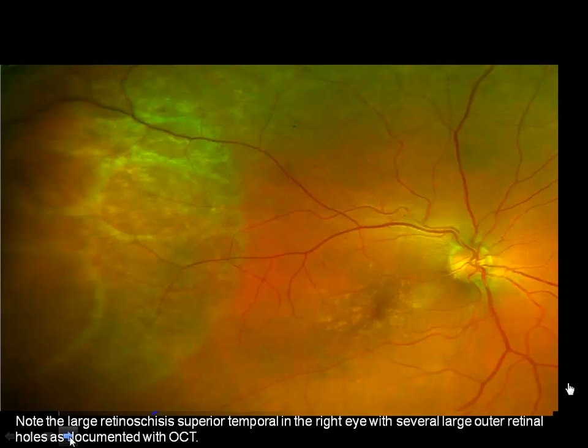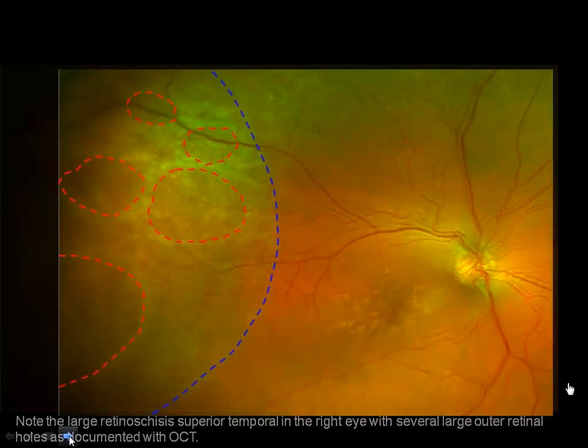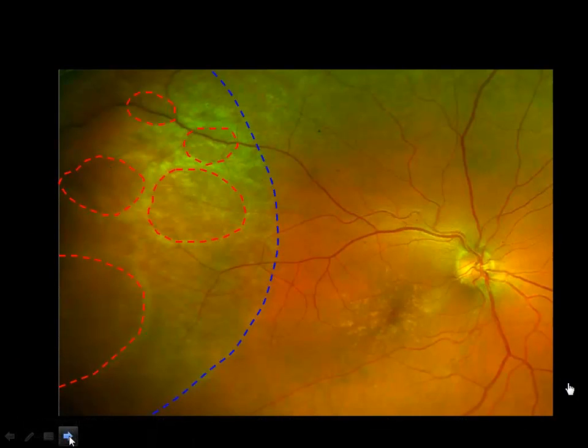Let's go a little bit further, and we can look at this. This is actually an OptoMap image. And the outline of the entire schisis is shown with the blue dots. The outline of the 5 outer retinal holes that we see are shown. Patients with outer retinal holes by themselves, without inner retinal holes, typically don't have to be treated. They can just be followed. And they certainly can progress.